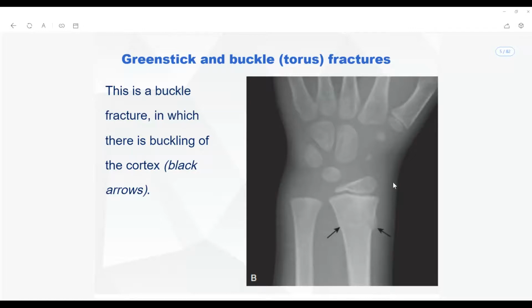And also, you see here, this is the metacarpal bone, and this is the thumb, which hasn't been ossified yet. You see here, this is the epiphysis of the thumb, and this is the metaphysis of the first phalanx. I'm looking at the metacarpal of the thumb, which hasn't been joined with the corresponding carpal yet. You can also see that there has been no ossification within the metacarpal of this bone here. So by this also I can say that this is a child of less than 5 years, something around 5 years.